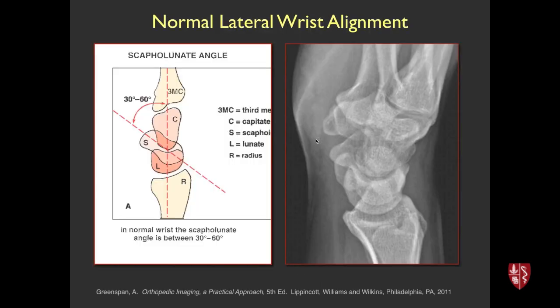The lateral is perhaps even more important. And I just want to highlight this scapholunate alignment again, because when you look at a lateral view, you should always try to glance and say, is it a good lateral, like nice neutral lateral, where what should happen is the radial styloid should kind of line up with the mid-carpus here, and the ulna should overlap with the radius. But you want to try to find the lunate here. So here's this moon-shaped structure here. And then the scaphoid's harder to see. It's sort of peanut-shaped. It's in here.